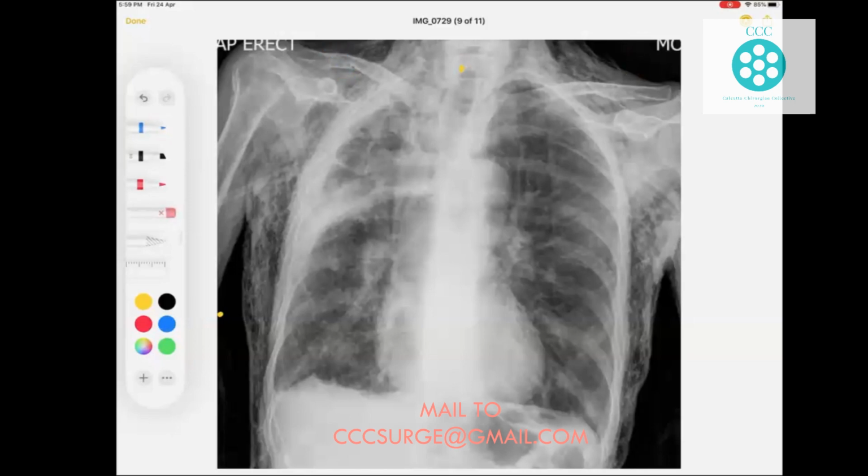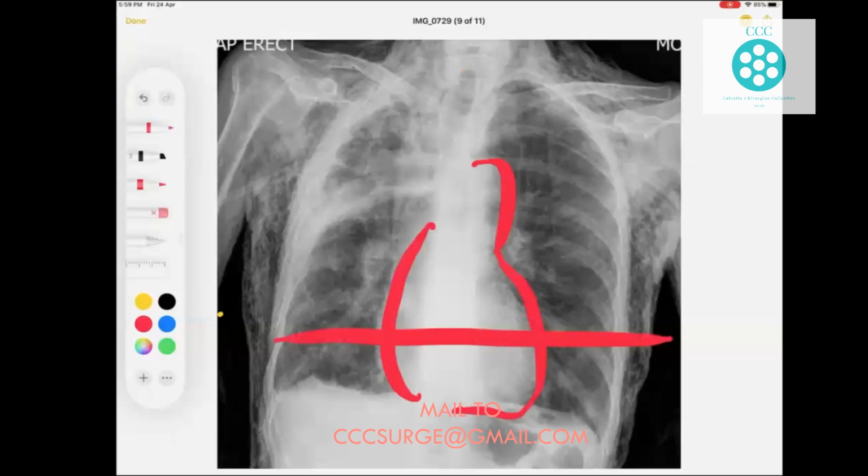Now, along with the clavicle being broken, the next other thing is, what about ribs? Do not know. Yes, a few ribs may be broken, but we need to get better x-rays, sir. Something is wrong, but clavicle is broken, sir. What about the C then? So the C in this story is the heart. Not bad, sir. Half of that. Okay. What about the D?